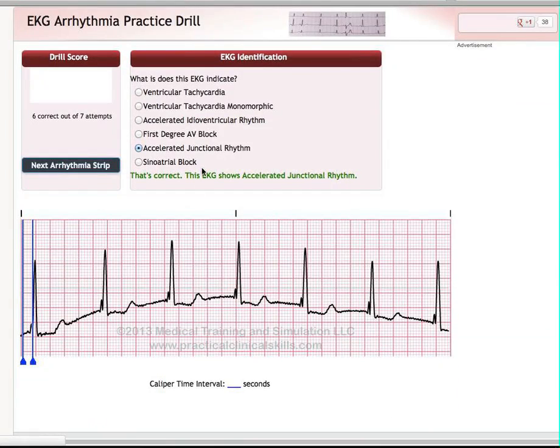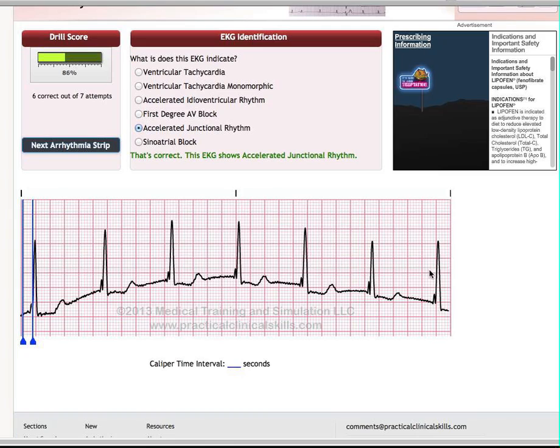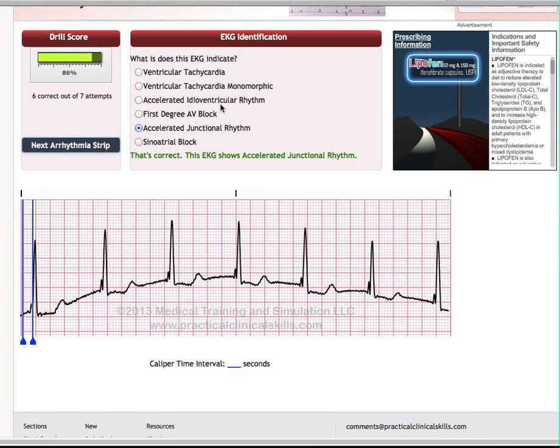So the two of them are kind of difficult to discern when you're looking at just one strip of an EKG. I don't know whether this looks like maybe a lead 2, but basically the difference between them is you want to look and see what the P wave deflection is, if you have a P wave, because remember, if it starts from the junction and you send a signal superiorly into the heart, into the atria, and inferiorly into the ventricles, you'll have an inverted P wave, but your QRS complex will look the same.